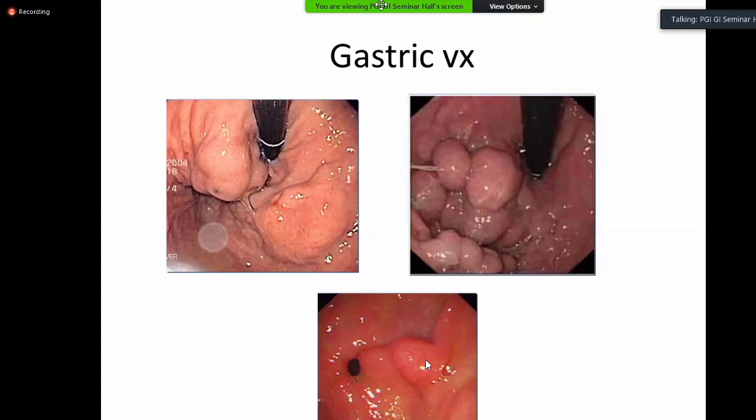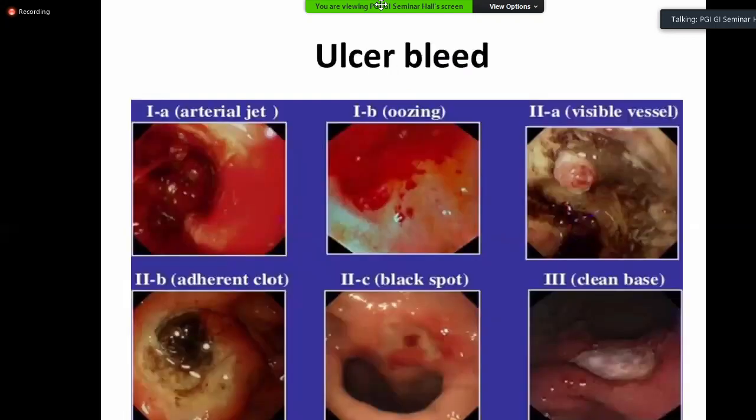This, in a patient of portal hypertension, will be described as isolated or ectopic varices. Given as a single picture, this will have a number of differential diagnoses. It can be varices, it can be a submucosal mass lesion, or just a thickened fold, a part of the thickened folds in hypertrophic gastropathy. So the differential diagnosis or the interpretation of the lesion is in the context of the patient, the symptomatology, and the rest of the physical findings.